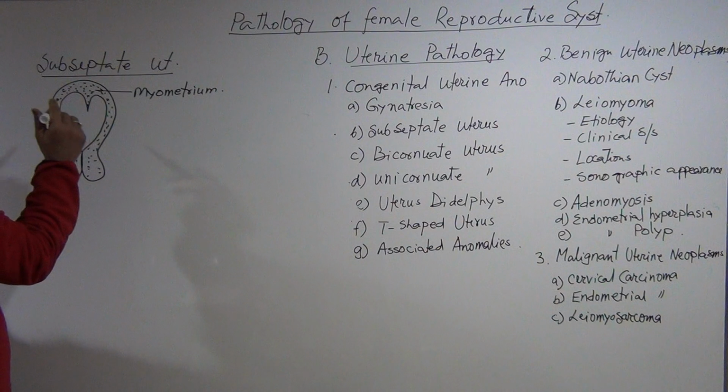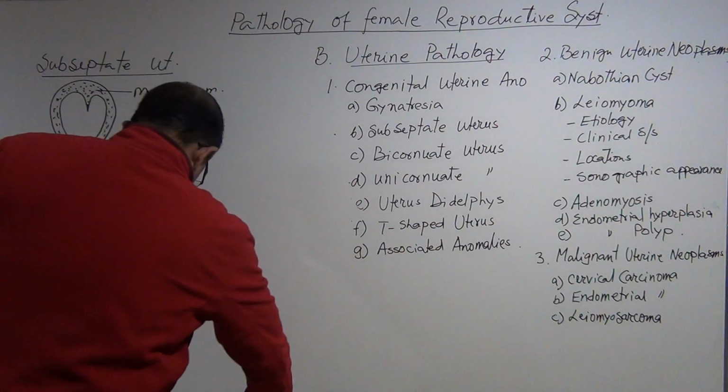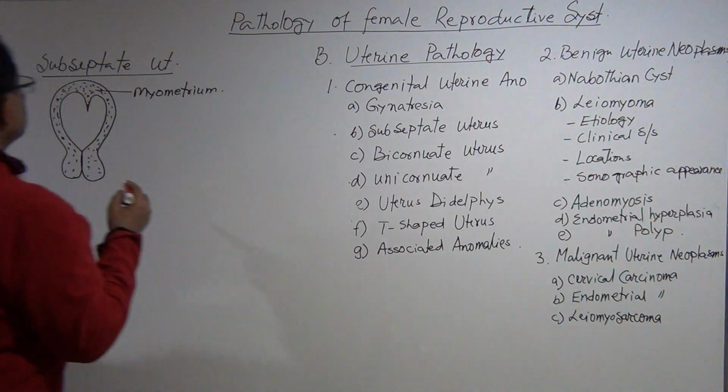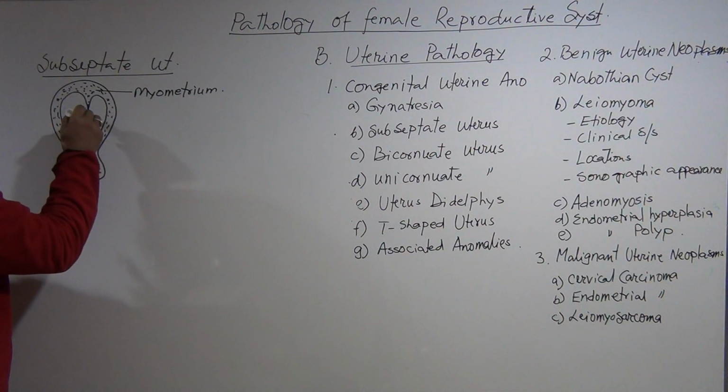And as a result, look at here, the endometrium. Let me use the red pen. Yes. This is endometrium. So then what happened to the endometrium?